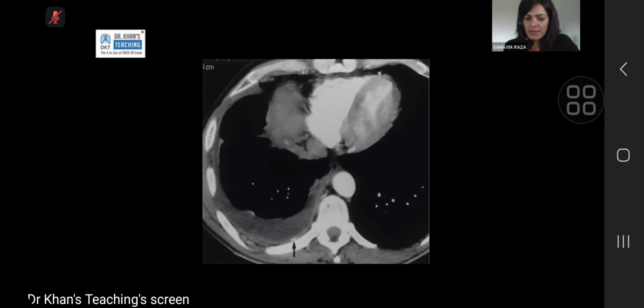can you assume that this is previous inflammation, or can you assume that this is malignancy? And the real answer, no matter how experienced you are, looking at that scan, that slice, is that you can't tell, because that fleck of calcification can be a remnant from previous pleuritis or tuberculous empyema that was drained 20 years ago, or that can be a fleck of calcification in somebody who's been exposed to asbestos. Being exposed to asbestos increases your likelihood of having mesothelioma quite a lot.